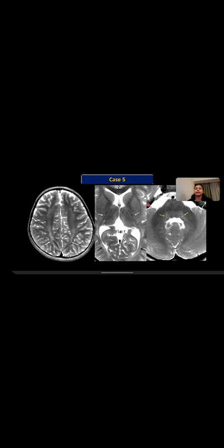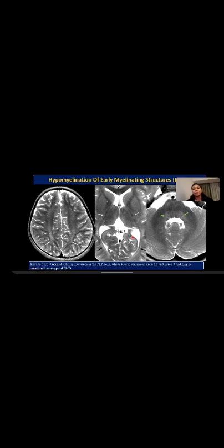When do these structures myelinate? We already discussed. So these are early or late myelinating structures. These are early myelinating structures as we discussed. So then any guesses? So in this, there is hypomyelination only involving the early myelinating structures. So this is a case of, okay, it's not HELM, it is HEMS. So this is a case of hypomyelination of early myelinating structures.